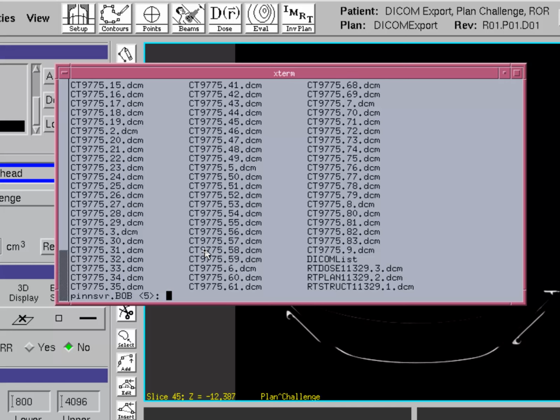It's very helpful in this process if you can clean this directory out. It'll make it much easier to manipulate and grab the files that you need. As I mentioned before, this does store your Dicom image files that come across from your scanners. So you want to make sure that you've already imported the patient and you don't need these images anymore. Just be very careful of that.